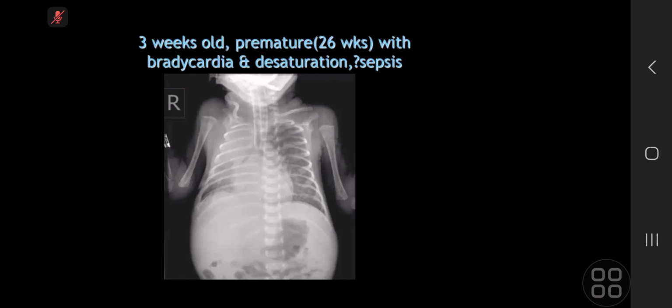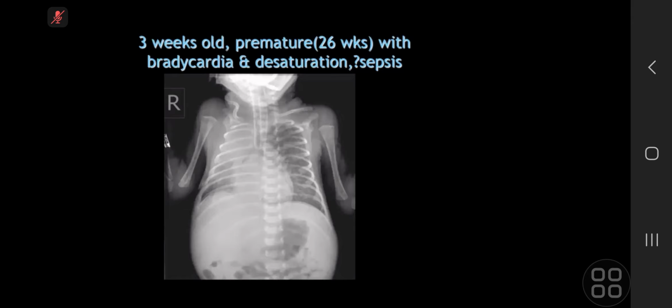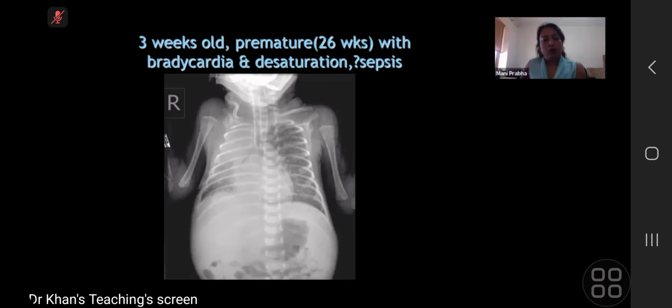It should be positioned well, and it should be informed to the clinical team, as it is obstructing the right upper lobe bronchus. Wonderful. Yeah, it is obstructing indeed, and it should be pulled up. What is happening in the rest of the lung? What else is going on in the lungs? Okay, the rest of the lung. It doesn't look normal? No, it doesn't.